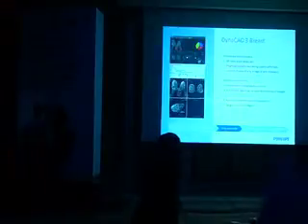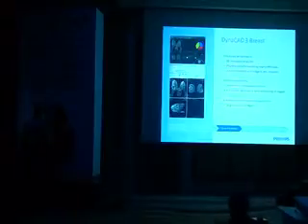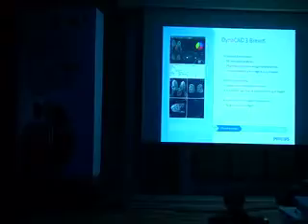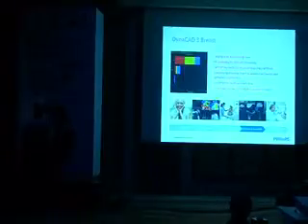DynaCAD breast makes an enhancement in the performance in all time points analysis and pharmacokinetics modeling, enhanced workflow and very fast workflow, and of course a very precise tool to target suspicious regions and to take the biopsy. Of course it makes it much easier and more precise, and there are a lot of papers showing that using this tool made it a much more precise way to have a guided MRI breast biopsy.